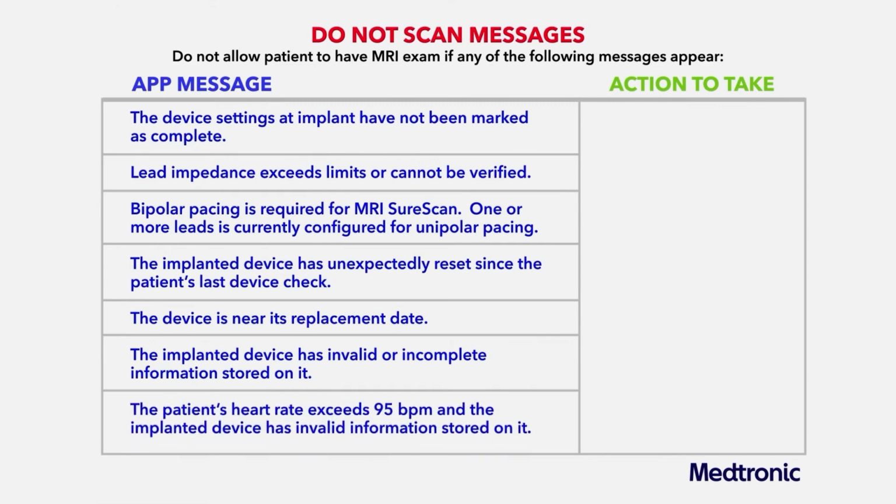Or, if the patient's heart rate exceeds 95 beats per minute and the implanted device has invalid information stored on it. When one of these app messages appears, you should notify the radiologist or physician who is supervising the MRI exam.